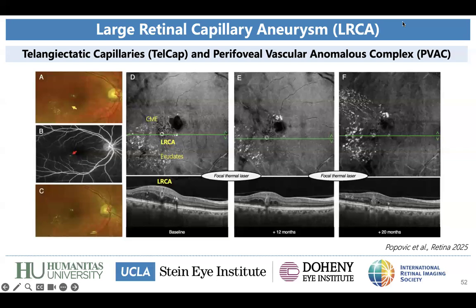Everyone has an opinion, but I don't have to do any other scanning or dyes, and I have this information. Totally agree, 100%. En face OCT for this type of aneurysmal lesion is truly the best in my opinion. You can actually visualize the lumen, the hyperreflective lumen, the ring, the distribution of the exudate, the distance from the fovea, which can actually not be visualized by cross-sectional OCT so well.